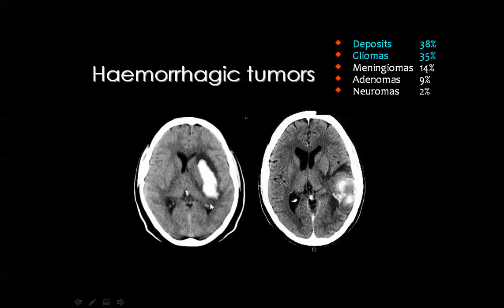Then if you see a hematoma inside the brain parenchyma, this hemorrhage may be one of two, either hypertensive bleeding or post-traumatic bleeding. A third source of hemorrhage inside the brain parenchyma is a tumor that has been the site of acute hemorrhage. And you know that many of the tumors, especially the aggressive ones, can bleed, and the most common lesions which show internal hemorrhage are the metastatic deposits and the aggressive gliomas, especially the GBM or glioblastoma multiforme.